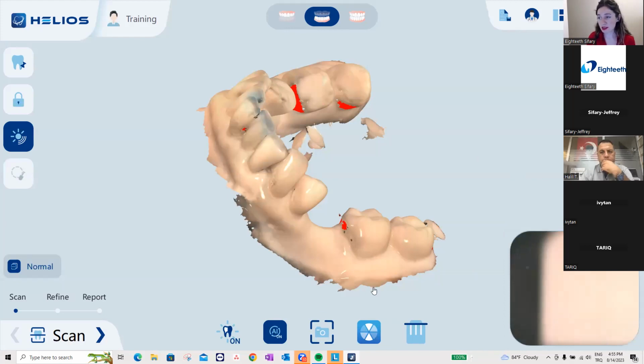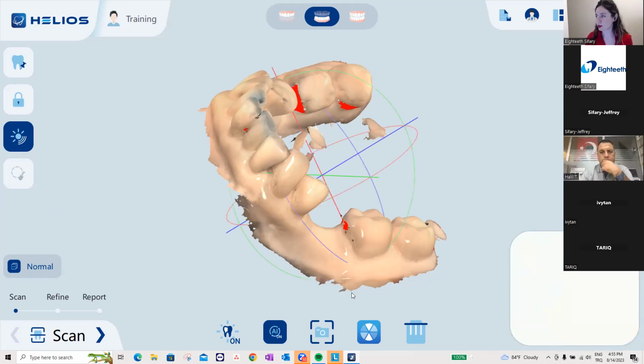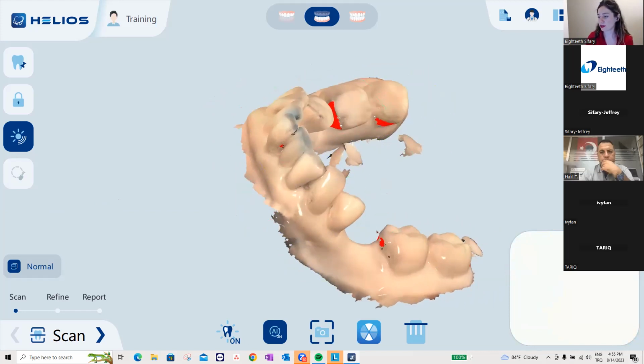And I really like there is a snapshot tool here, which you see in the lower middle, there is a camera option. Okay, it's taking a snapshot. The snapshot has been taken, and if I just let me go back, click here to open it.